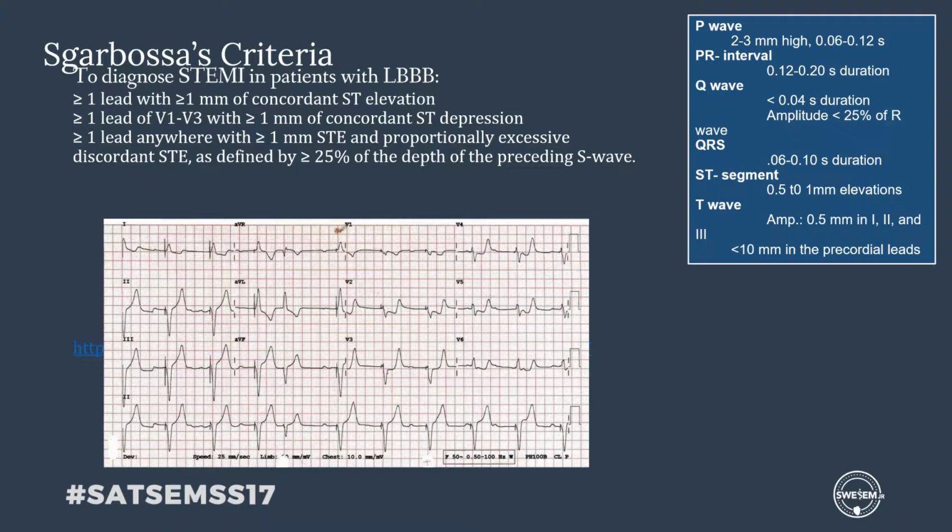This is a bit confusing, but take a look at the ECG presented. We see here that in leads V2 to V4, there are significant ST depressions. No need to measure these guys, they're definitely more than 1 millimeter. These precordial leads are in complete agreement with one another, i.e. concordance, as they are showing signs of ischemia that reflects the posterior wall of the myocardium.